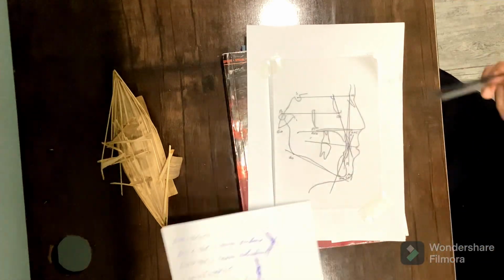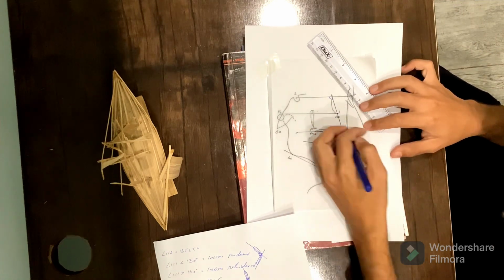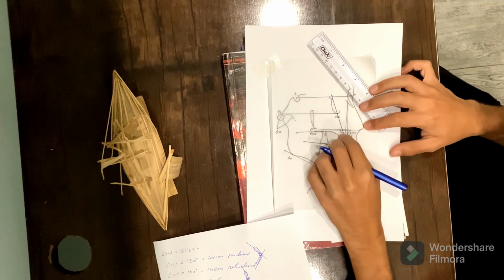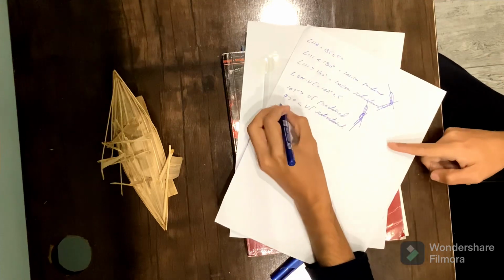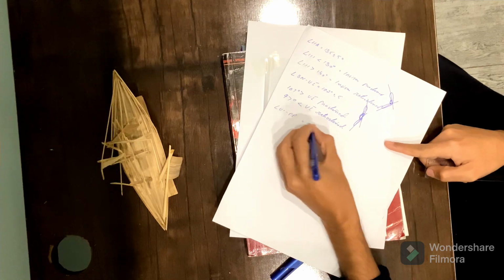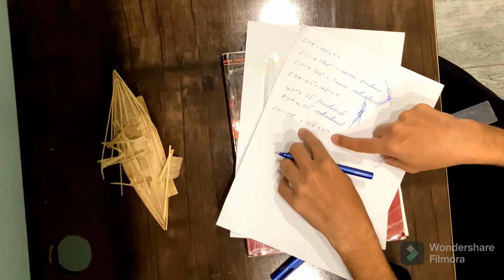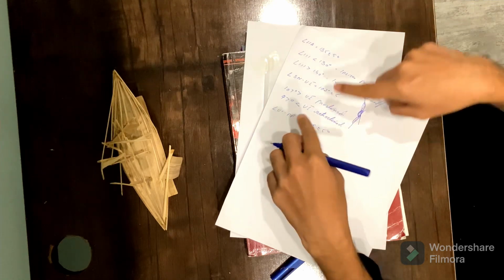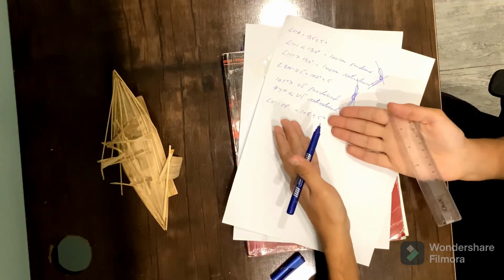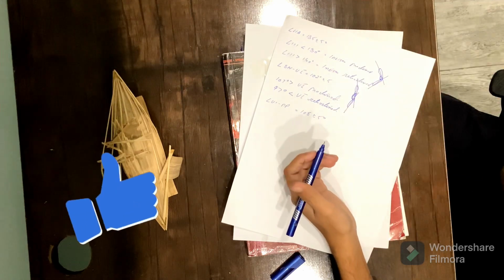The next angle is the one which the incisor line forms with the palatal plane. The upper incisor to palatal plane angle should be equal to 108 plus minus 5 degrees. This angle tells us the relationship of the upper incisor with that of the maxilla. Similarly, if it is greater than this value, it is proclined, and if it is lesser than this value, it is retroclined.